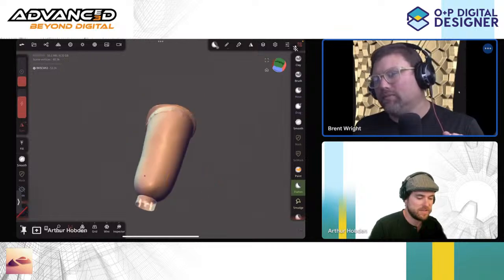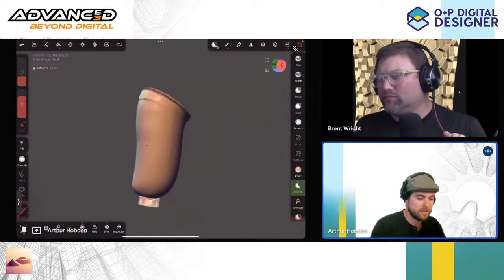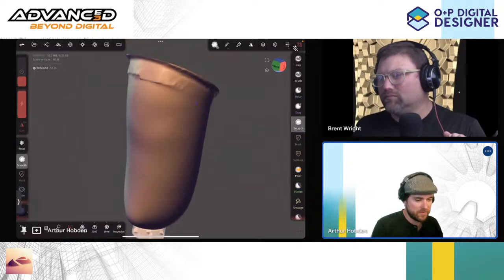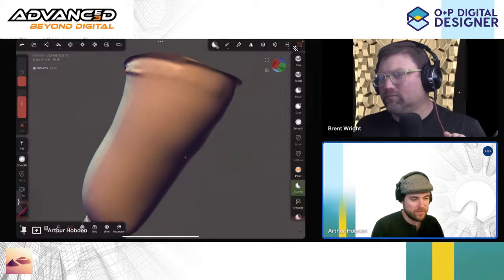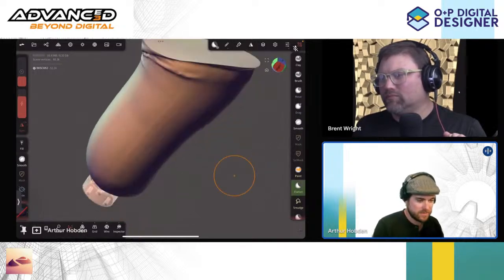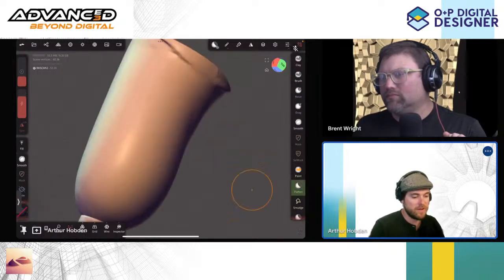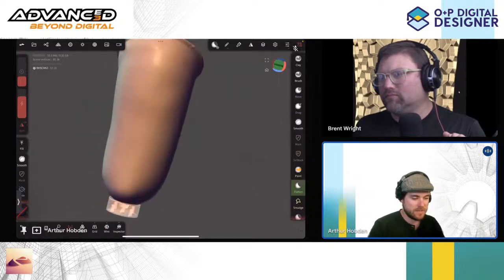Yeah, I don't think the D feature is specific, but I know what you mean. Some CAD packages have that. A lot of this other stuff, like these small seams, aren't really going to affect my outcomes for quad meshing. All of that tends to just fall away when we reduce the resolution. Right now we're working in 60,000 points, and I'm aiming for a quad mesh of about 1,200. So it's going to be very, very small compared to what we have. But I would say that looks okay.